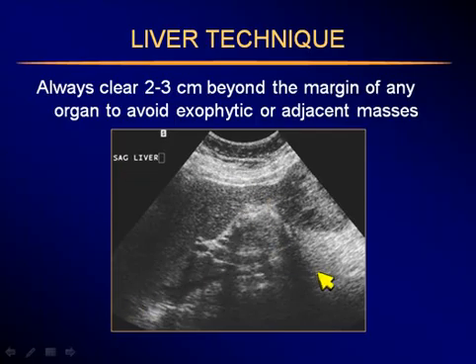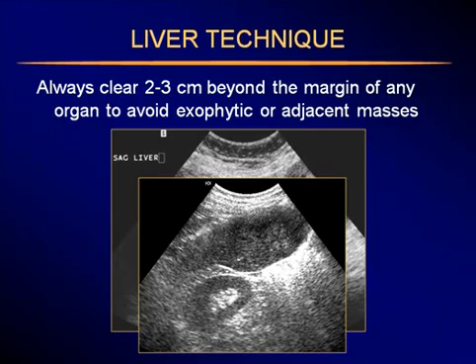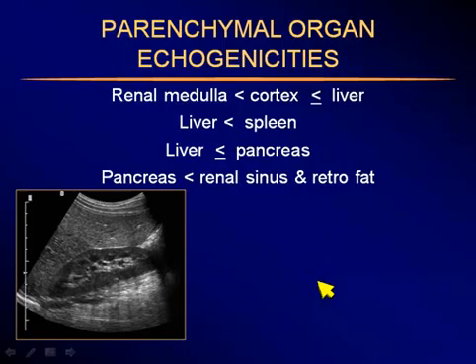By the way, this was a hepatocellular carcinoma, a hepatoma, 5 centimeter hepatoma hanging off the margin of the liver. And if you think that this is an anecdotal or unusual case, here's another case that we had fairly recently. Hanging from the inferior margin of the liver was this large mass, another hepatocellular carcinoma hepatoma, and that's the right kidney here.